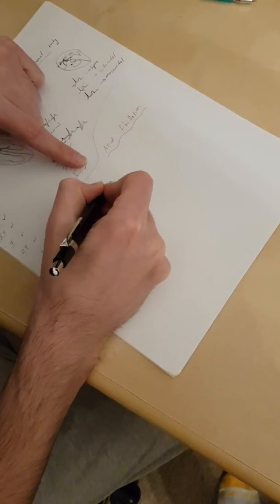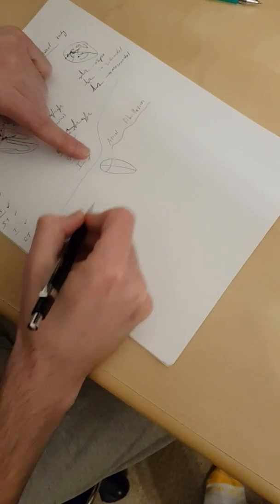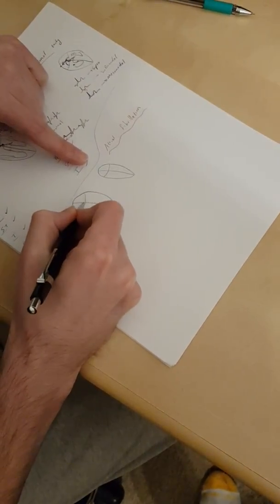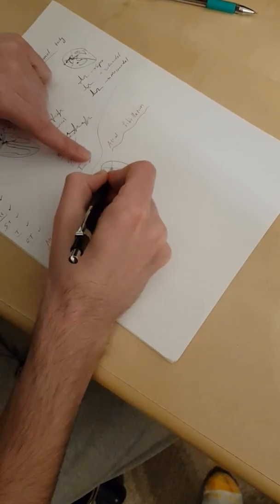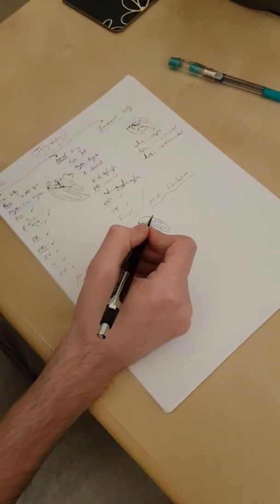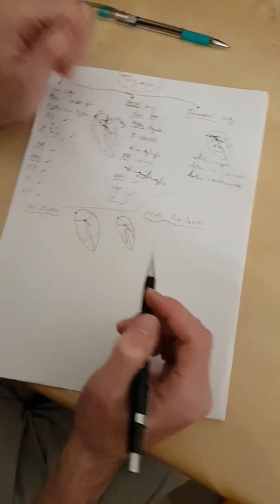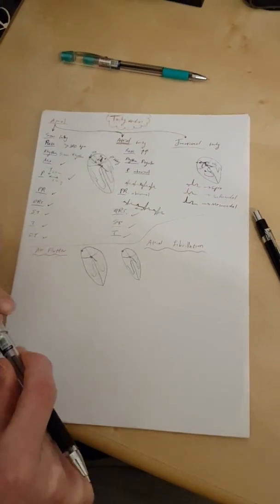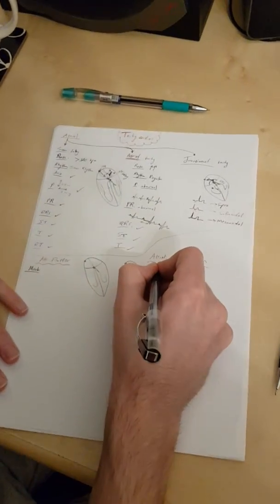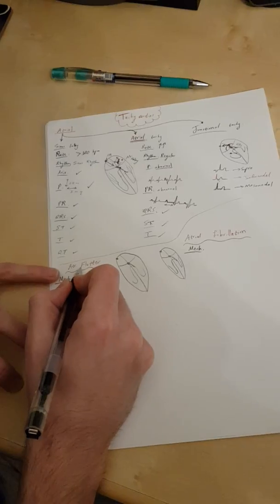Let's keep drawing. Okay. Now, first thing that you need to know about the flutter and fibrillation is the mechanism. This is very important in the exams, both exams, third year and sixth year. Now, the mechanism for atrial flutter is that instead of the atria being one unit, as we know, both atria are supposed to be one unit. They depolarize at once, they contract at once.